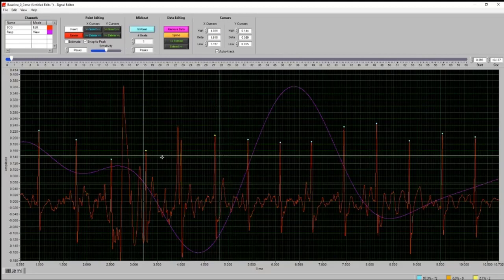If we do that, what you'll notice is that the application will tell you how many beats should have occurred within these two. It's going to focus on this window and then how many beats should have occurred there. It's determining that based upon the surrounding average IBIs for this segment. And if we place them on the outside here, it says you've missed one beat. We had a pretty good idea that was going to happen, and we'll hit midbeat. This will place a beat at, in this case, the mathematical middle between these 2 points.